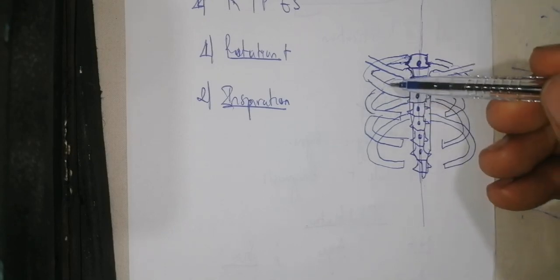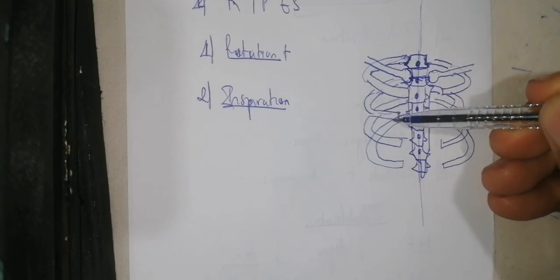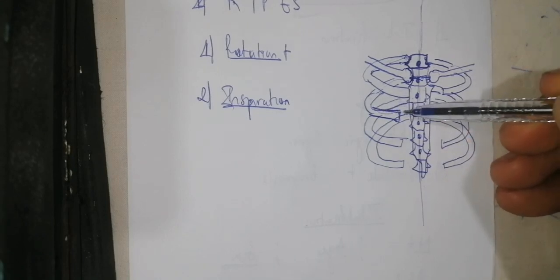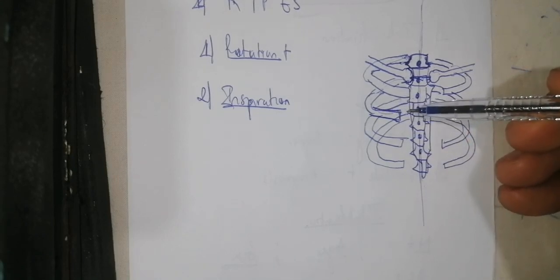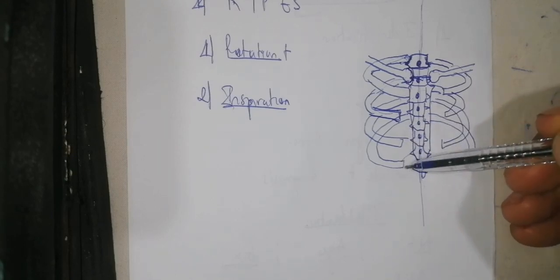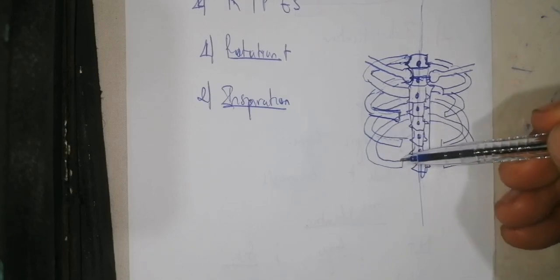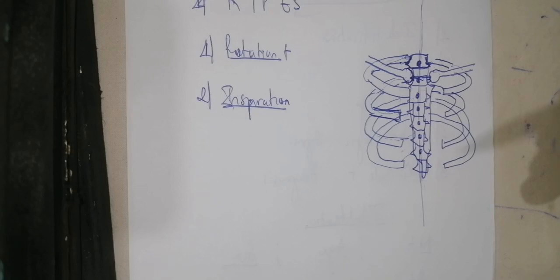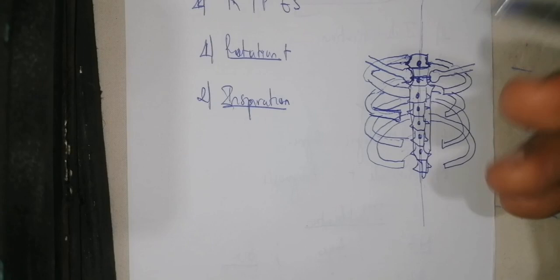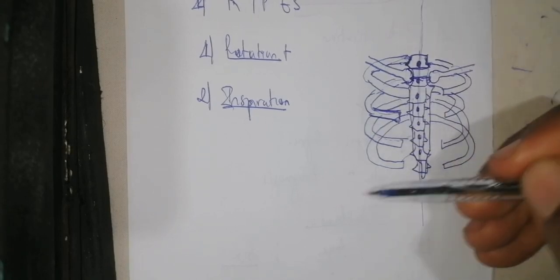Now the anterior ribs, where normally when you're coming in front, you need to know that the anterior ribs are the ones that are going to stop. Is it clear? Because at the medial aspect of the anterior rib, you're going to have the costal cartilage. You normally have the costal cartilage, but it cannot be seen with the X-ray. That's why you see it clear going in front if you take a true X-ray. Is it clear? So that's how we count the posterior and the anterior rib. So it's better to count the posterior rib from posterior. So we count 1 posterior, 2 posterior, 3 posterior, and 4 posterior.